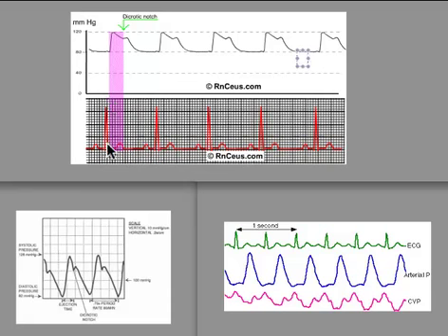So you would expect as the ventricle contracts that here the A-line waveform, our pressure, is going to go up. You'll see a sharp rise after that QRS complex. In the A-line waveform, it hits 120 in this case. As systole comes to an end, you'll see this A-line waveform drop down to what's called the dicrotic notch. This is actually representative of the closing of the aortic and pulmonic valves.